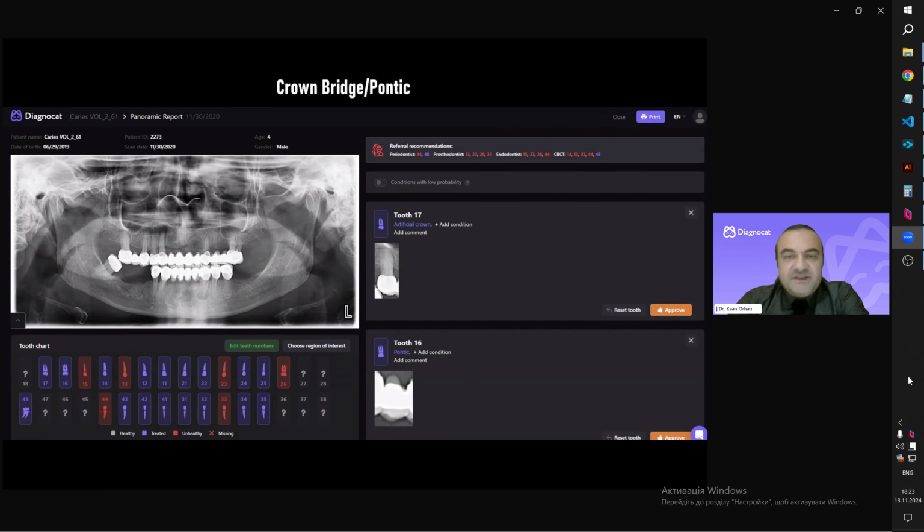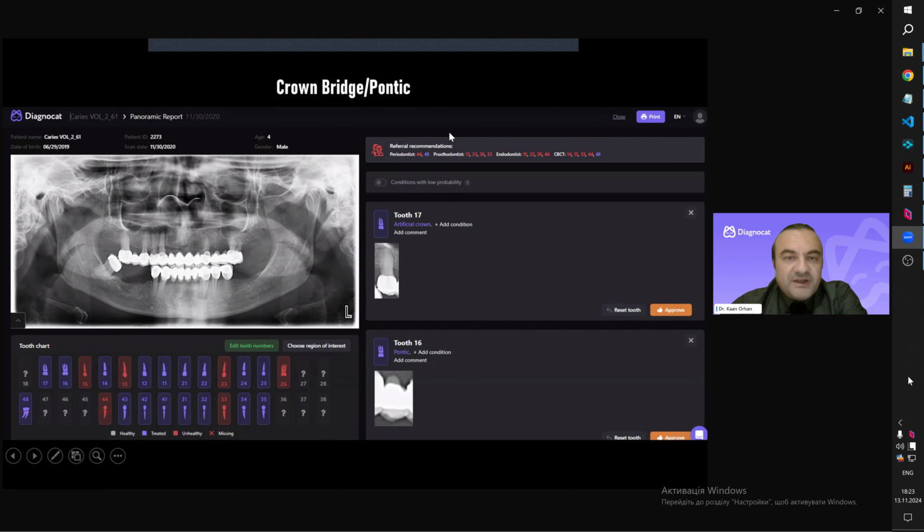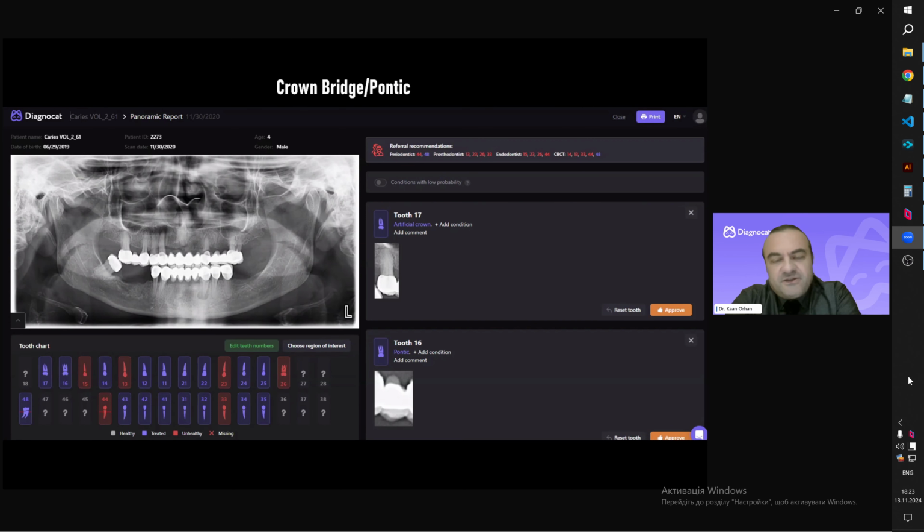Another example is the referral recommendations. I was mentioning all about the diagnosis and also the segmentation of DiagnoCat from 2D and 3D, but there are also referral recommendations. So DiagnoCat can tell you about the pathology and also recommend a referral, right?